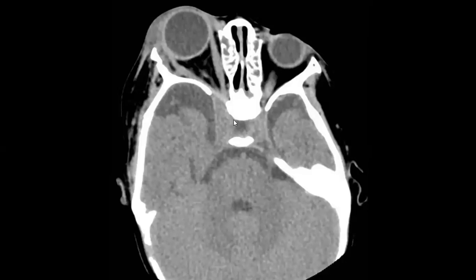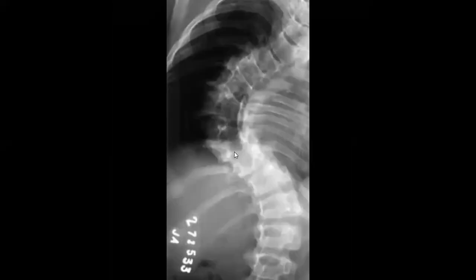So in this case, check the other manifestation with sphenoid wing dysplasia and macrocranium, orbital enlargement. Yes, it's very important, neurofibromatosis type 1 in the exam. And if you ask for the spine, you check if this patient has any deformity, like what is this called?